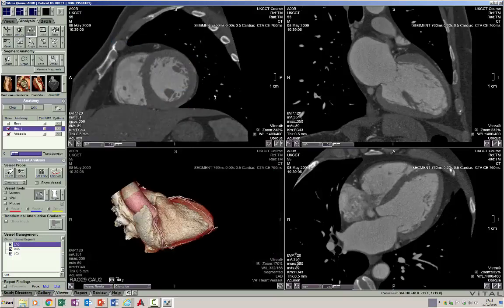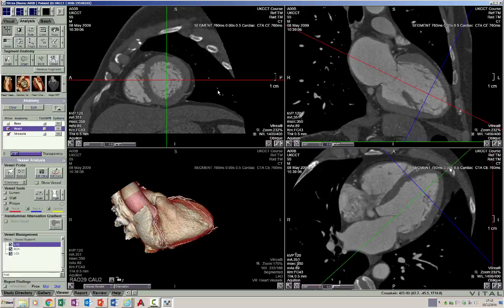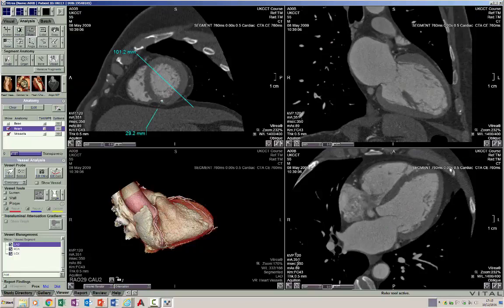In the apical third, however, so this is the apical third passing through the apical third of the ventricles, the left ventricle is divided just by the two diagonal lines. And here we have the apical anterior wall, apical septum, apical inferior wall, and the apical lateral wall. And the last segment is the apical cap itself, or the apex.